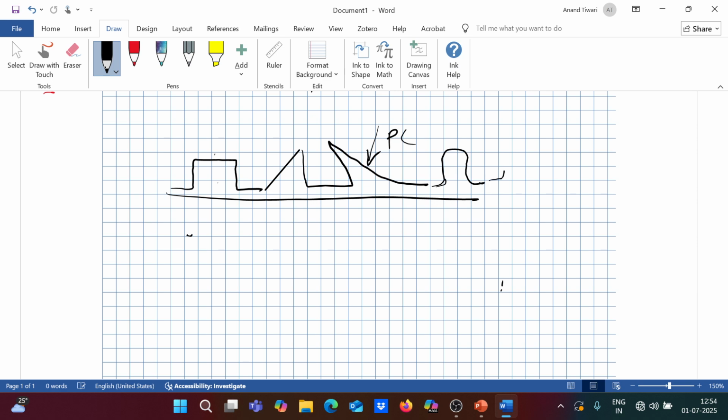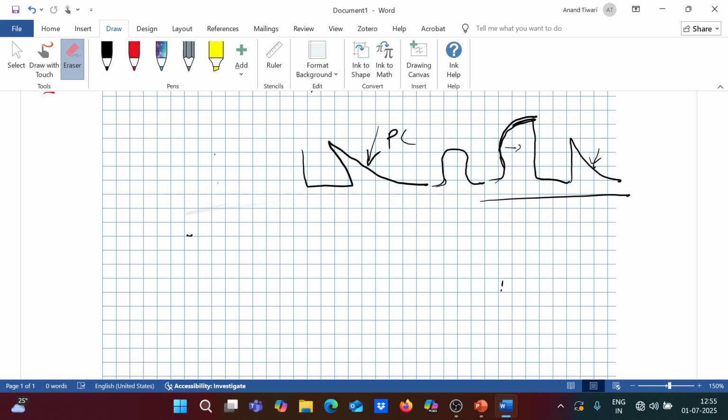And you see the exponential rise. This you see when the alveoli are recruited, as an exponential rise in the pressure time curve. And then there is the exponential decay below the baseline, which may depict the expiration. So just keep these various waveforms in mind while we move further in understanding the various graphics.